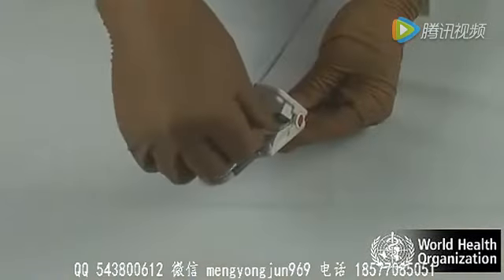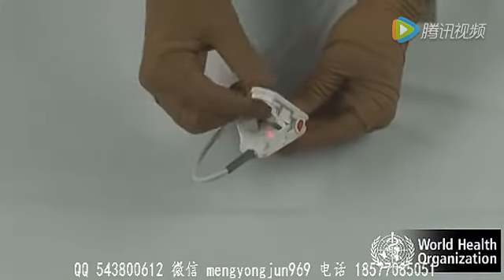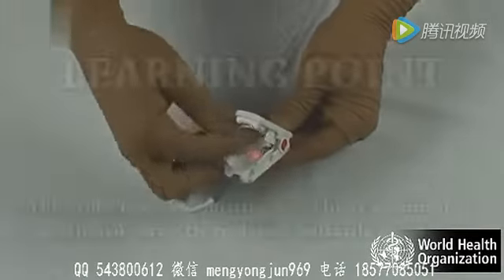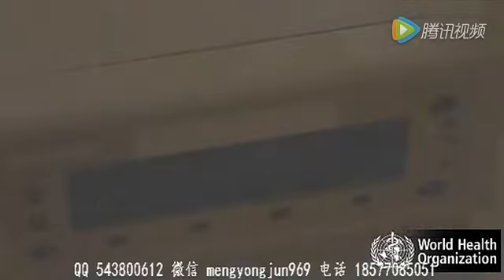The lens and detector should be kept clean. Use soapy water or an alcohol-soaked swab to gently clean dust, dirt, or blood from the probe. Learning point: in order to get a satisfactory reading, the probe must be emitting a red light and must be correctly positioned to detect pulsatile blood flow.